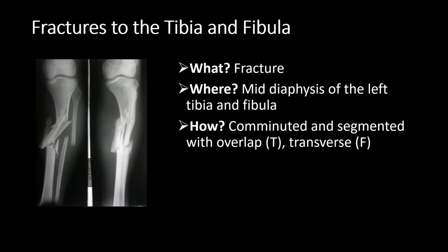So what is it? It's a fracture of the mid-diaphysis of the left tibia and fibula. How? It's comminuted with a segmental fracture, and there's a transverse fracture of the fibula, and there's significant overlap.